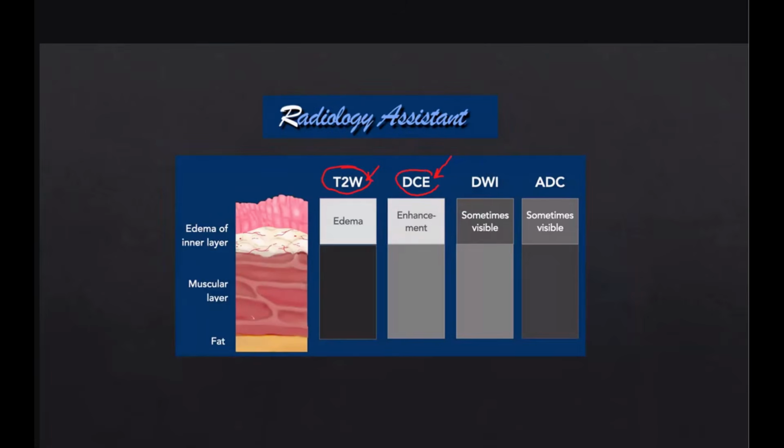So if we have a bladder tumor, for example, this is the urinary bladder wall, and this is the mass. And deep to the mass, if we have an enhancing layer along the mucosa of the urinary bladder deep to the mass in the dynamic contrast enhancement, it is considered as a good sign, because this is considered as an inflammatory process deep to the mass. Hyperemia of the adjacent mucosa. So we don't have a gross invasion to the muscular layer.